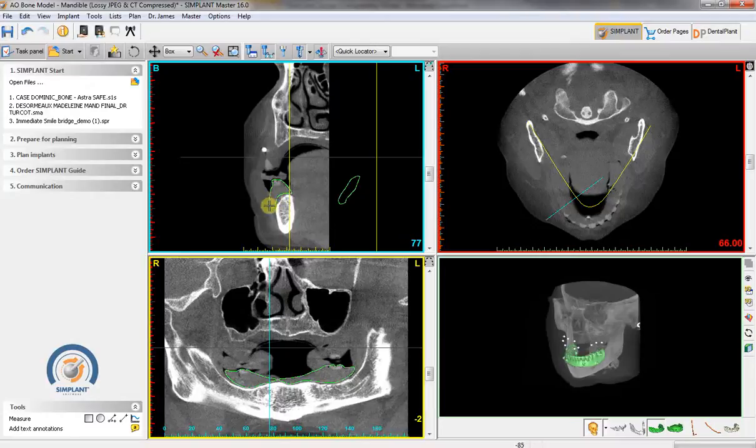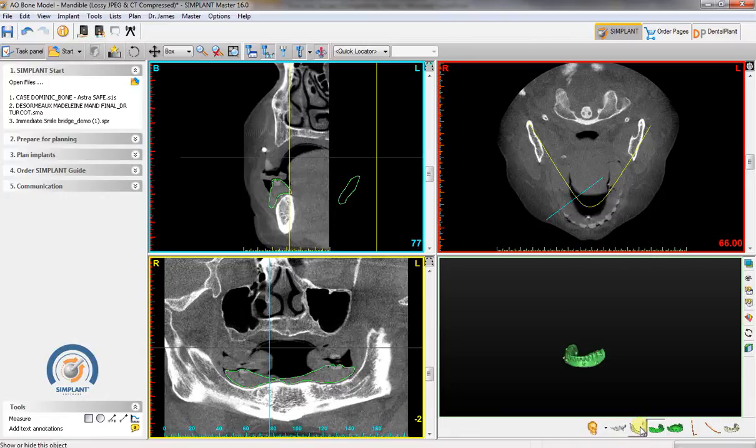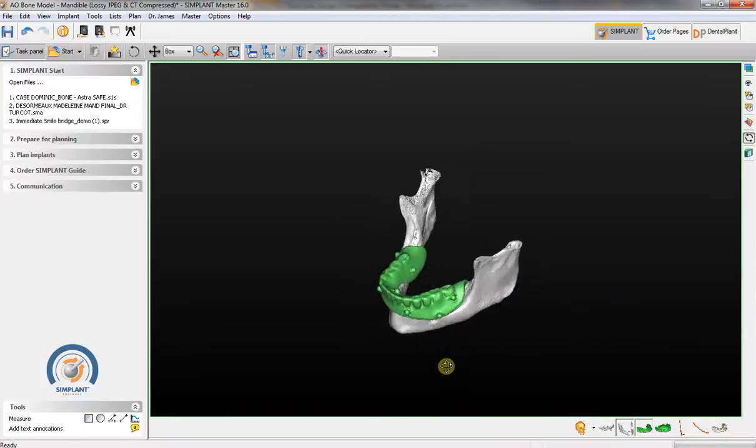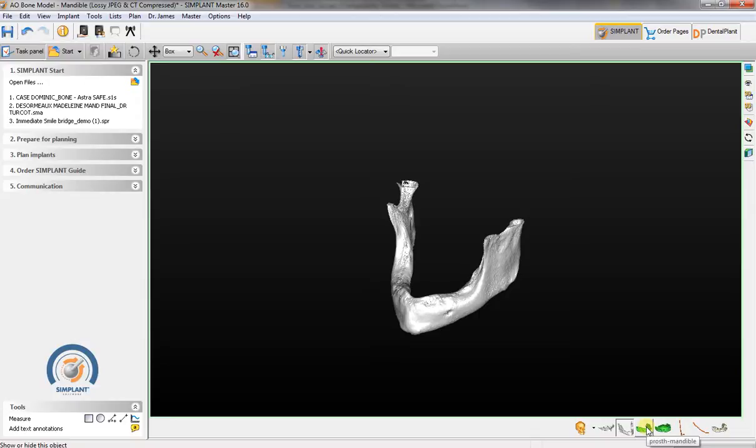we can actually identify now where the prosthesis is, and we can also determine the mucosal thickness, and basically the space between the bone and the outline of the denture. So let's take a little bit of a better look here. Now this scan has been already segmented, so we're able to see not only the bone but the denture itself. So this is what it looks like with the 3D objects being placed here. So I can remove the denture scan and I can just put it back in.